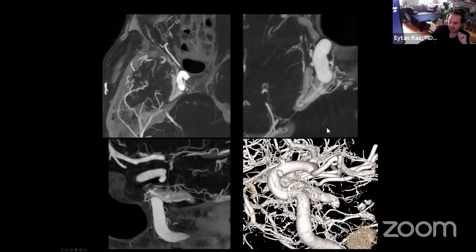But if you look at this image in detail, there's something a little odd. It seems there is a little cutoff here and here. This is the superior petrosal sinus. It seems like there is a cutoff. So maybe it was a vessel like this that partially thrombosed, right? You look at it on axial, or on sagittal. Look at this, even on 3D, it looks the same. It seems there was a continuation that somehow got thrombosed. So that's where the idea comes from.